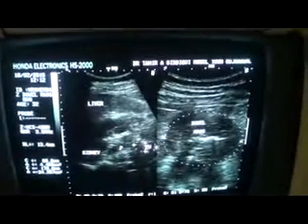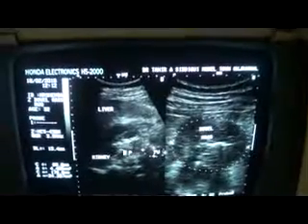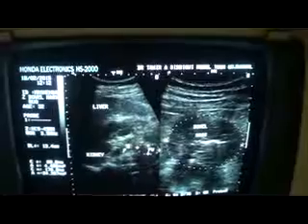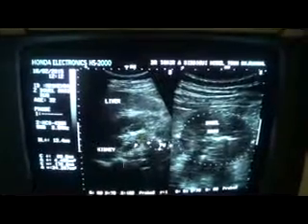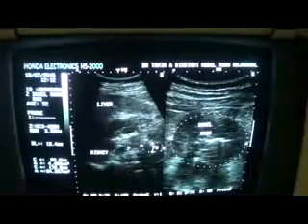having trapped air in its lumen, on the proximal ureter, which is dilated up to 13.5 mm, normal being 7, and a minimally dilated pelvis with debris within it, because a normal pelvis should have been as black as this area. So this is our case of the day. Thank you very much.